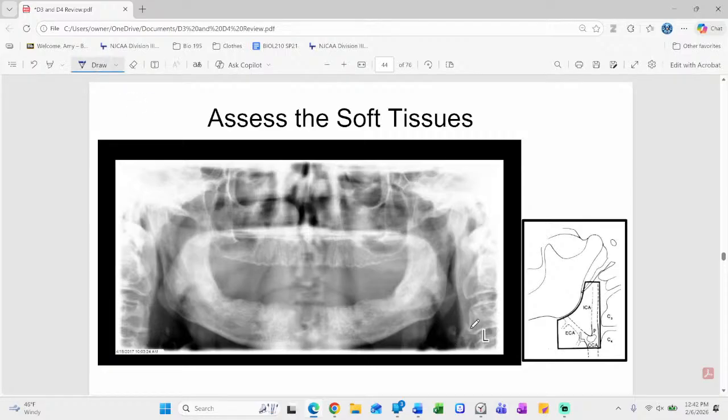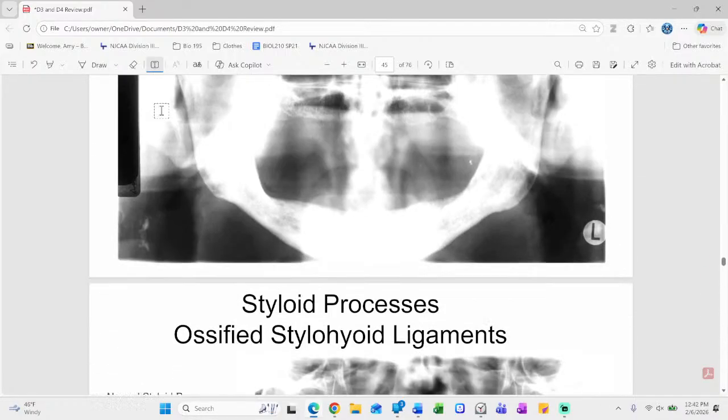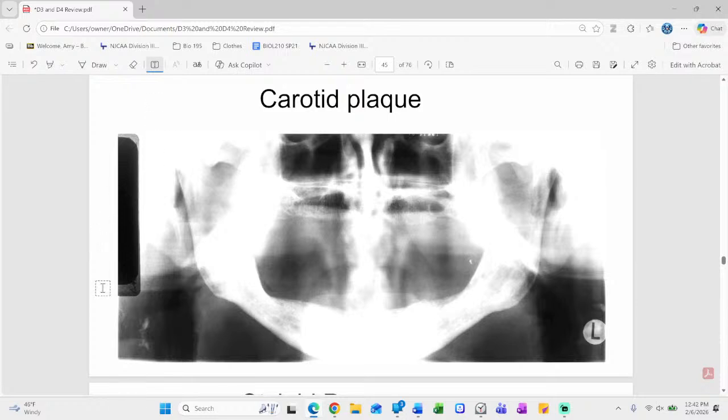All right. Can't find styloid. Hyoid is off. So if hyoid is off my image, for sure I'm not going to see any thyroid cartilage, right? Because you know anatomically how far below that is, right? I lightened this one purposely so that you could see the carotid plaque down here. The vessel is narrow and vertical. That's how it's going to fill the walls. As the walls start getting sticky, that's when the plaque starts gathering.